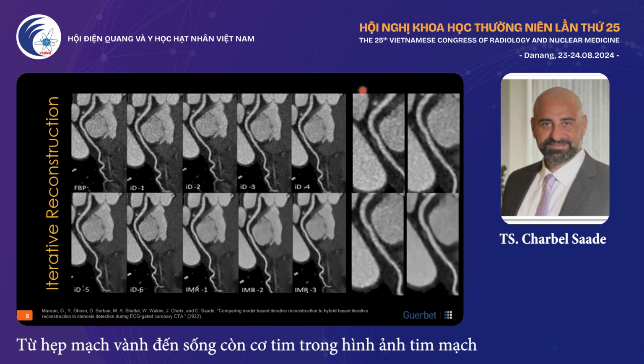So if I take both extremes, when I look at the filtered back projection, we see there's myocardial bridging at the right coronary artery. And then also, if I take, for example, here, this is iDose 4, you can see there's a lot more clearer information and it looks a little bit wider. When I come back down to model-based, which is this one here versus hybrid, you can see that this is more glossy, but you can see a nicer, smoother outline, and there's less noise sitting around the lumen, which shows us a very rare right coronary artery myocardial bridge.